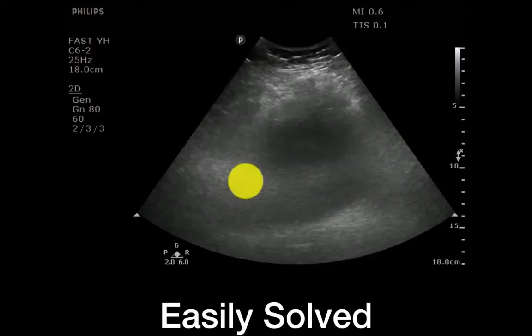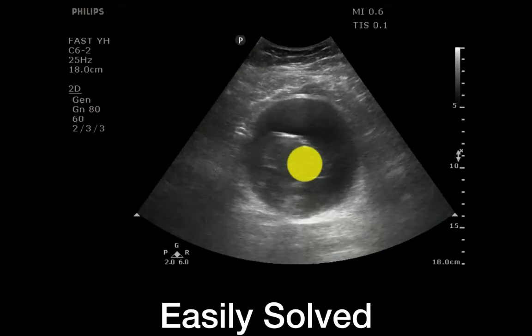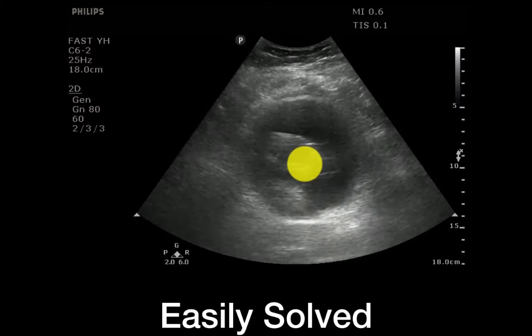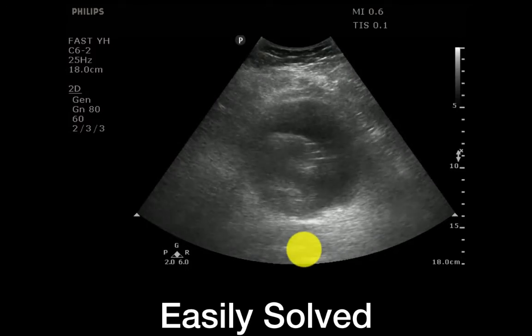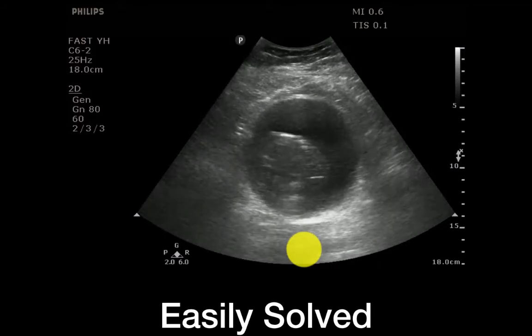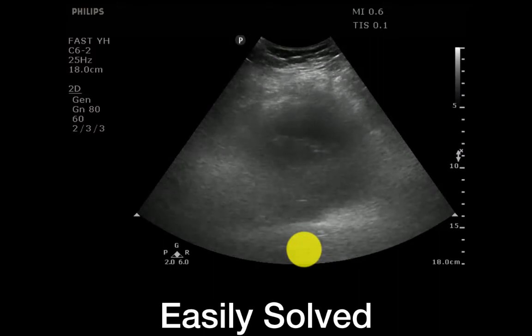Now this is a urinary bladder, and this is a clot inside the urinary bladder. So this is way down in the pelvis, and sometimes these folks with really distended bladders can really encroach up into the abdomen, but we're not seeing that vertebral body, right? That vertebral body really is key to diagnosing that aortic aneurysm, or at least identifying the abdominal aorta on ultrasound.